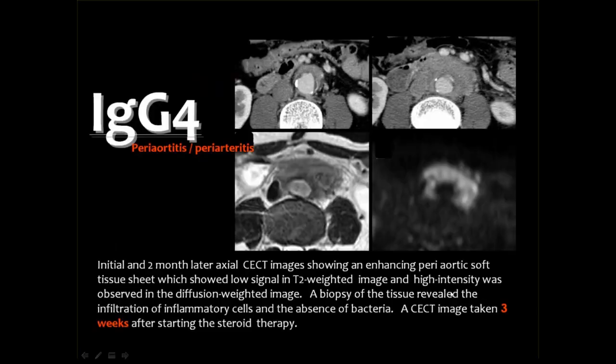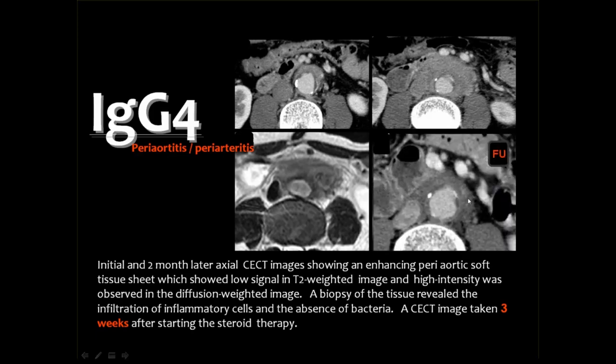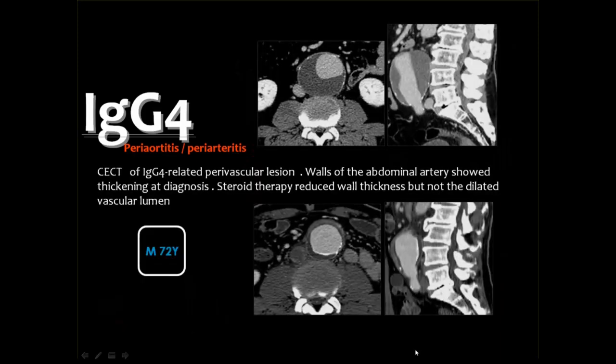And here also you see periaortitis with a significant soft tissue enhancing mass around the aorta, and it appears of low signal intensity in the T2 weighted image with diffusion restriction. The follow-up after 3 weeks of steroid therapy showed a significant resolution of the disease.